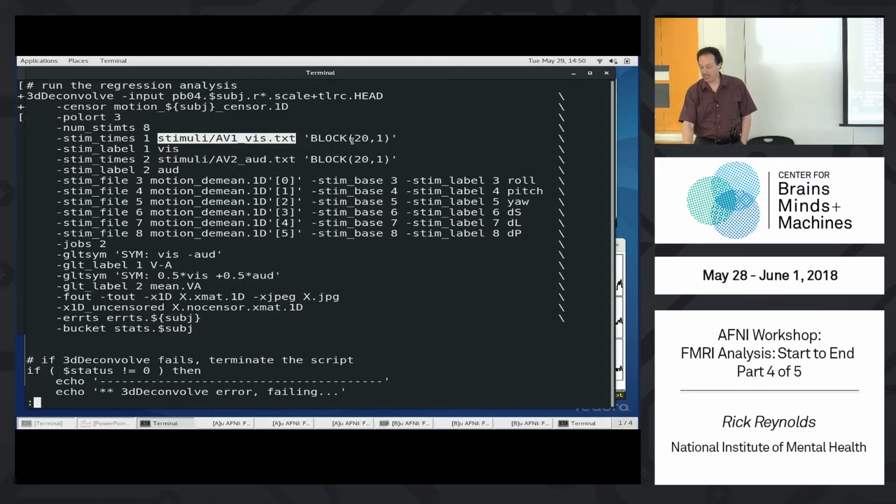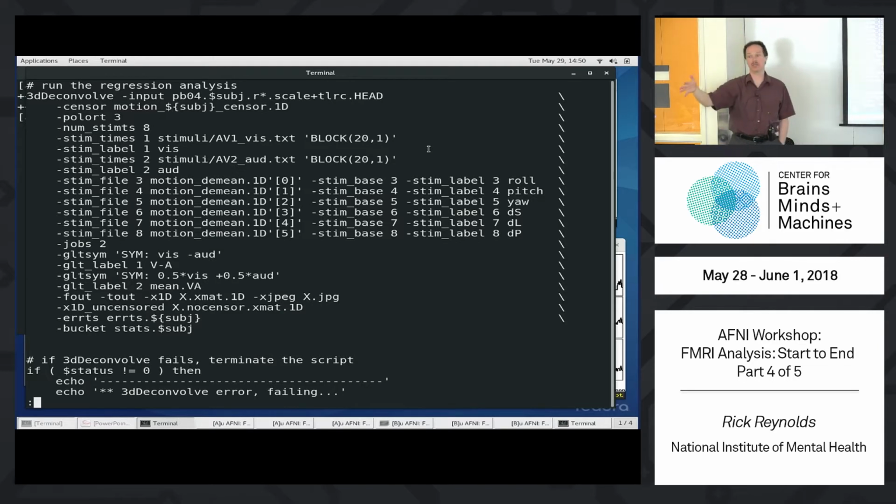And we tell it to model our events by convolving a 20-second boxcar with the 15-second block curve. And again, each one of these will be a 35-second response curve. And we'll assume the model is based on having all of the responses to the visual stimuli be the same. That's why the regressor is all the same. All the shapes are the same.